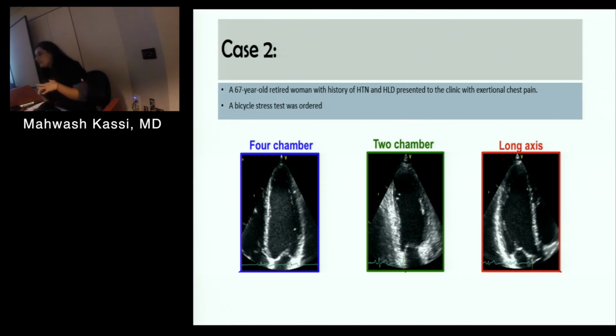Yeah. So a very simple way to remember it is, remember on the 2-chamber view, it's just anterior and inferior. This is anterior, this is inferior. Basically, what you see towards the outside is always going to be anterior. So this is anterior, and then you always know where the septum is, right? Except for this 2-chamber view. So you've identified anterior, you know where the septum is. So this is anterolateral, and this is inferoseptum.